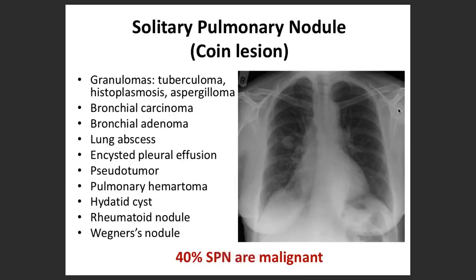Yes. So we are all concerned about money, but in chest X-rays as well, we also talk about coins. So what is a coin lesion? Coin lesions, for example, up to 40% of the time they are malignant. So if you see such patients, rule out malignancy. This is one of the important things, especially for all the doctors, I would really like to say.